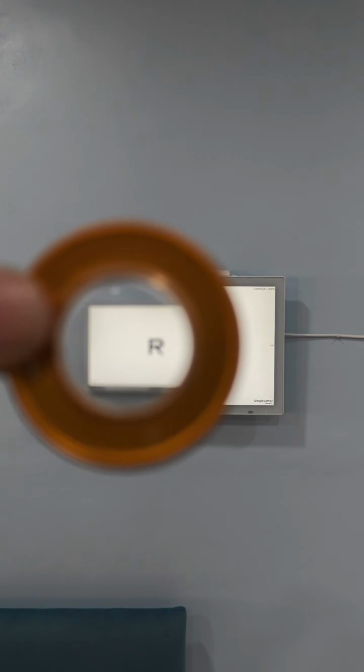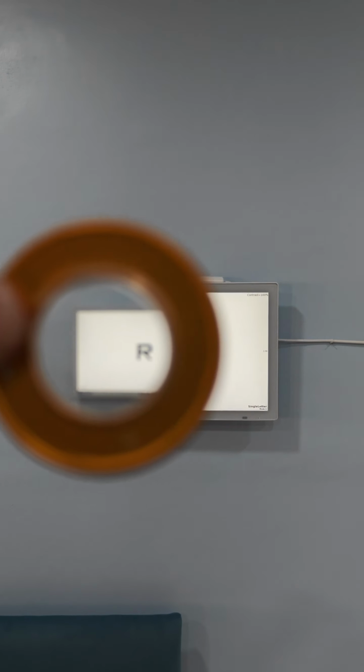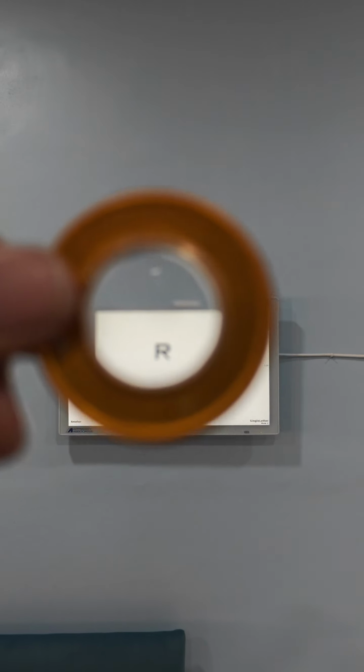Now take this another lens for instance. Again, repeat the same process. Hold it at an arm's length. Look at the target object through it. Here, you will notice that the image appears minified. So you move on to the second step of identification. Move the lens from side to side or from up to down. Here you will notice that the image appears to move with the direction of movement of the lens. Hence, it is a concave lens.